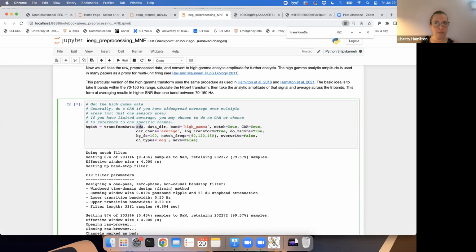And then your other question about interpolating channels, I typically do not interpolate between the channels because in this case they can be different enough. From what I've seen from good channels, I don't know that it's a great assumption that you would be able to interpolate over the bad channels like you would for EEG. So I do not.